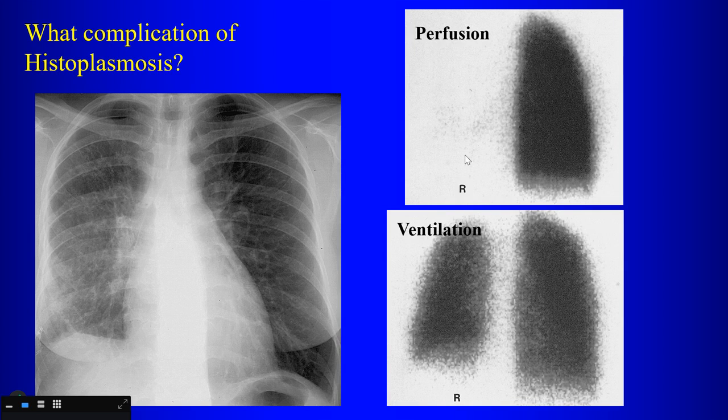You would expect pulmonary embolism to give you, is it theoretically possible for a PE to give you complete obstruction of just one pulmonary artery and nothing on the other side? I guess, but not very likely. But the chest radiograph does show that you have a unilateral abnormality here, right? And so trying to put the two together, this doesn't look like PE.